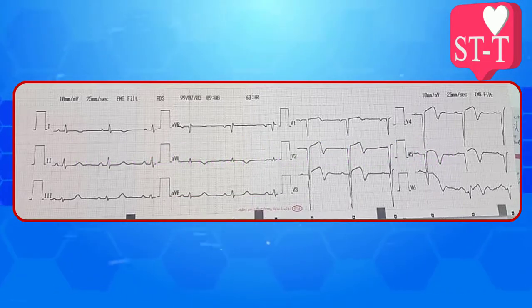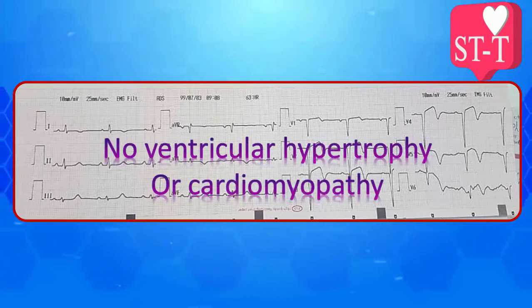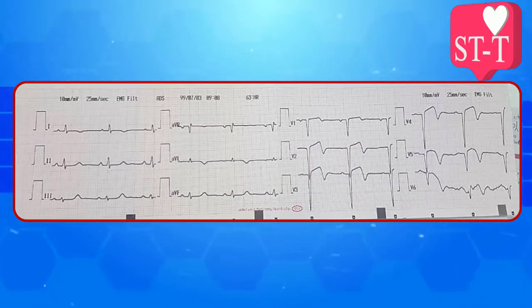In this electrocardiogram, neither RVH nor LVH criteria are present. Therefore, ventricular hypertrophy and hypertrophic cardiomyopathies are not probable. What about Wellens syndrome? As we all know, the hallmark of Wellens syndrome is deeply inverted or biphasic T waves in precordial leads. So, someone might wonder whether this EKG is demonstrating Wellens syndrome.